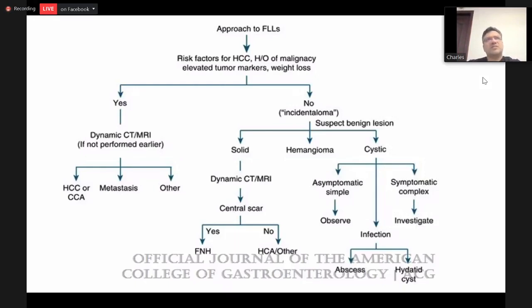Whereas if you see a cystic lesion with small daughter cysts, you see calcification on the wall, you see the water lily sign, then that is a hydatid cyst. And you have the WHO classification of CT findings in hydatid cyst. In ultrasound scan, you can find the trilayered cyst, with that floating pattern, and if you see the movement, once you see it, you'll not actually forget that. But the problem is you may not be able to see the movement in all the patients. But once you see it, it's very classical.